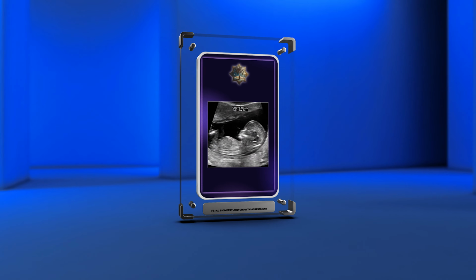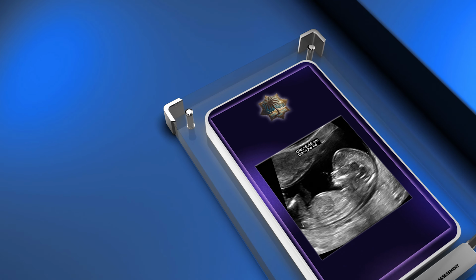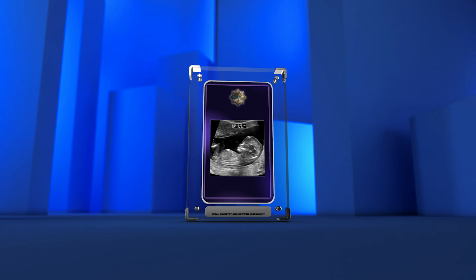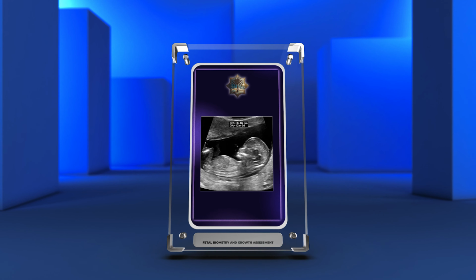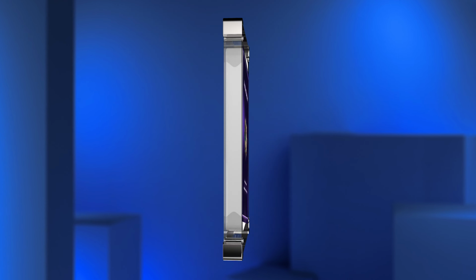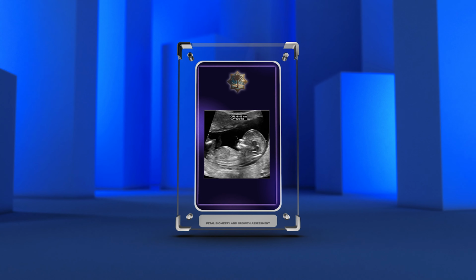Hello everyone, and welcome to today's lecture on obstetric ultrasound and fetal biometry. We will explore how ultrasound imaging can help assess fetal growth and development. We'll discuss measuring techniques, Doppler ultrasound for fetal well-being, evaluating placental function, and identifying fetal anomalies. Let's begin our journey into obstetric ultrasound.